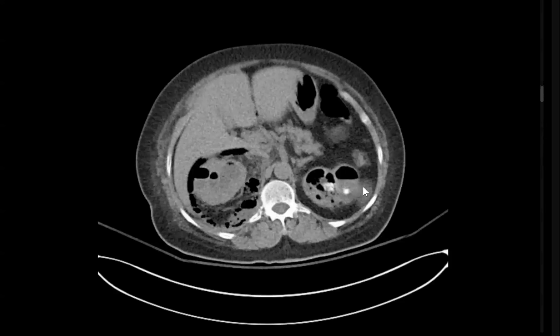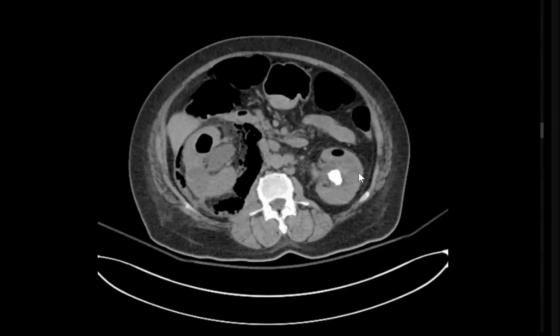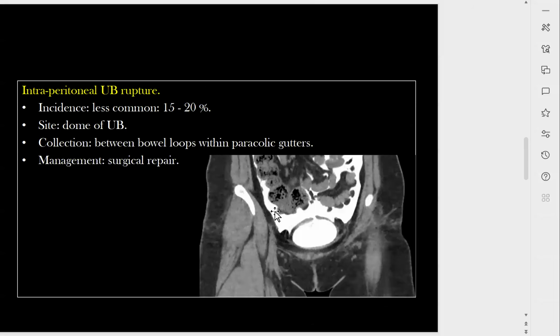I'm not sure about the staging of emphysematous pyelonephritis. No problem, it's okay. Just give me the mouse. What is the expected treatment? Surgical emergency, and empirical antibiotics because the patient is likely to be immunocompromised. And if it is unilateral emphysematous pyelonephritis, especially at an advanced stage, it's a nephrectomy, because it's a fatal condition. Emphysematous inflammatory conditions are usually fatal in this type of patient.